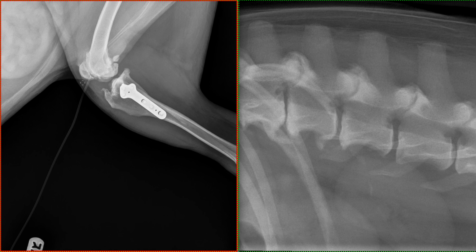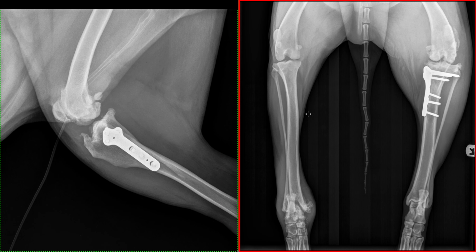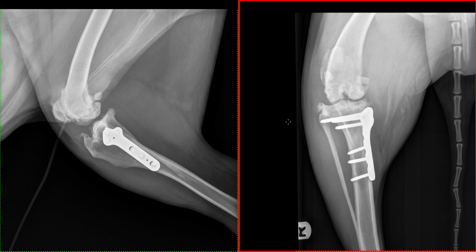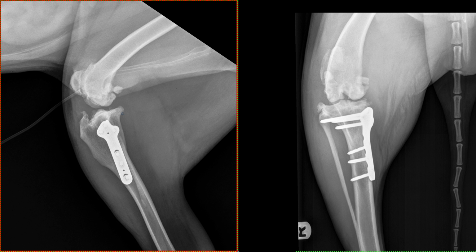Let's take a look at the right stifle. As we set up these images for evaluation, what we do notice is that a urinary catheter is in the plane of the urethra and overlies the patella and distal femur. We observe increased soft tissue opacity within the capsule that results in distension of the caudal margin.